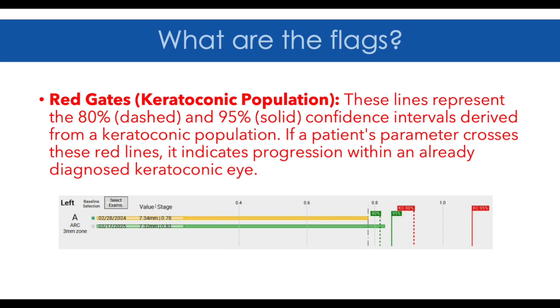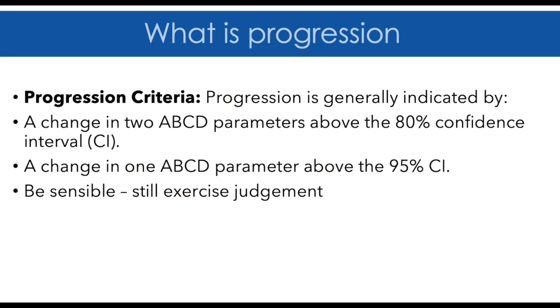So now let's look at what it means to determine if there is genuine progression using the ABCD progression criteria. So what constitutes progression?